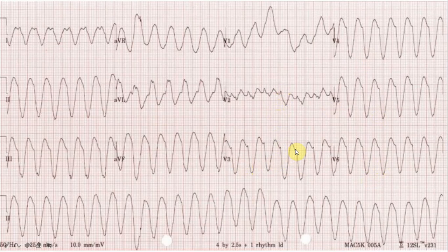I cannot see any R wave. I cannot see any S wave either, because I do not know which one is positive and which one is negative. If you consider this an S wave, then there is no R wave, and if you consider this an R wave, there is no S wave. So this patient has the first Brugada criterion present, which means that I cannot differentiate between the R wave and the S wave. If you find this type of pattern, it is very likely, with a specificity of 100%, to be VT.